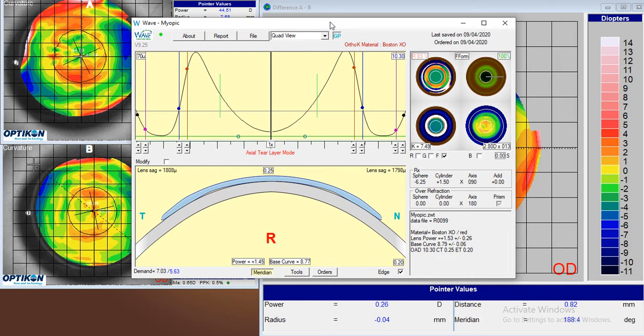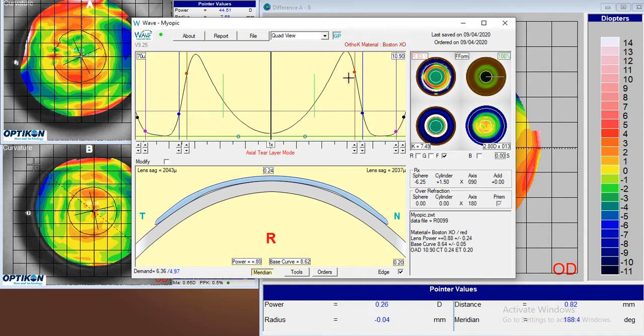And a larger lens will give us usually just more room out here in the alignment zone and help to stabilize and center that lens and keep it centered. So I'm going to increase this to a 10.9. So keep in mind that when we change the overall diameter, the software also shifts the position of each control point. So while we started at 6.268, we're now at 6.672.